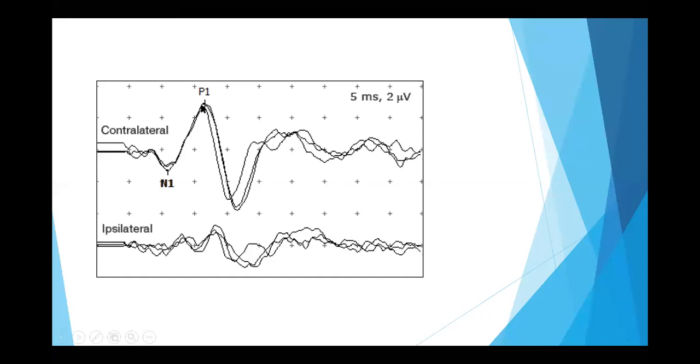Okay, here we are more concerned about the first peak, not this one. Why not this one? We don't know, because as I told you, there is not much research done on the OVEMP. So when the authors reported, we have to consider this. We just agree with what the author said before we do our own research and find out. So this will be N1, this will be P1. The latencies will be 10 and 15 millisecond. This will be 10 millisecond, this one will be 15 millisecond.